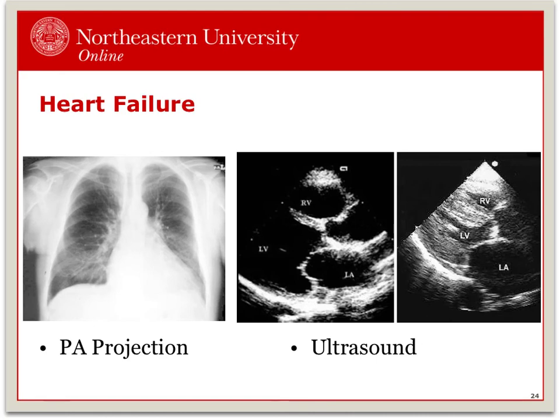Heart failure can first be noted on radiograph. You would note a large heart shadow greater than 50% of the lung diameter. Further imaging is indicated to identify the extent of heart failure. An echocardiogram report will identify the left ventricular ejection fraction. Image 1 is a PA chest radiograph demonstrating cardiomegaly.